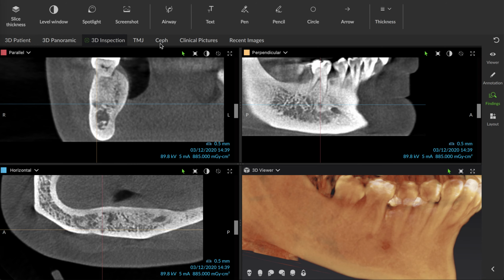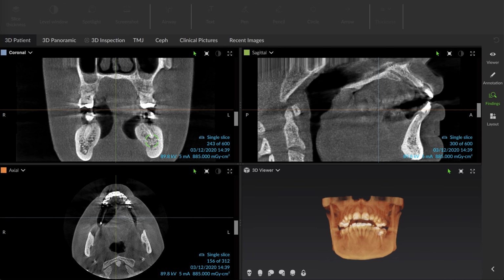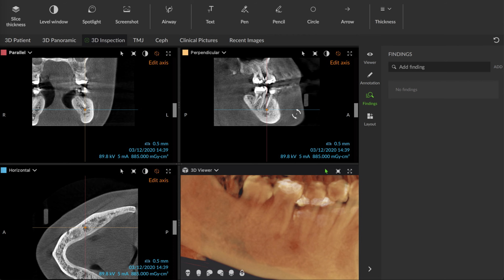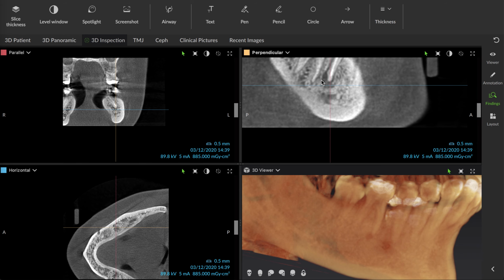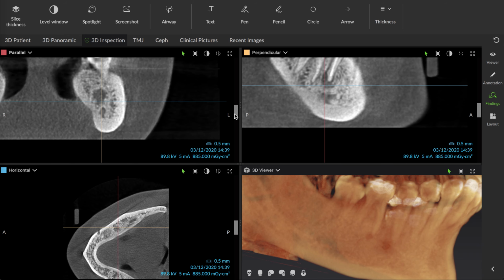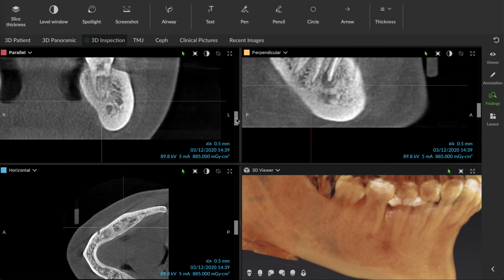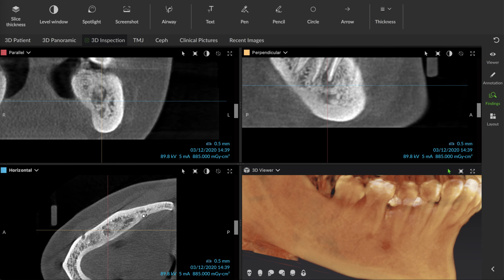Let me go back and pull up that tooth number 19. And this one, size-wise, this abscess is much bigger. So it's definitely something that we recommended urgent treatment for. Ideally I'd recommend trying to treat them concurrently. But if you look at the size of that hole in the bone, adjacent to that root space, it's really significant, a significant risk to her health.